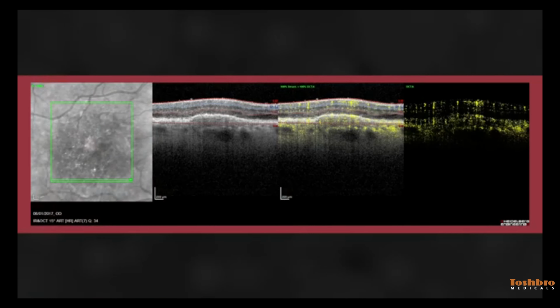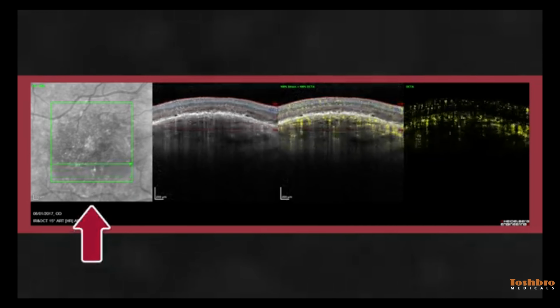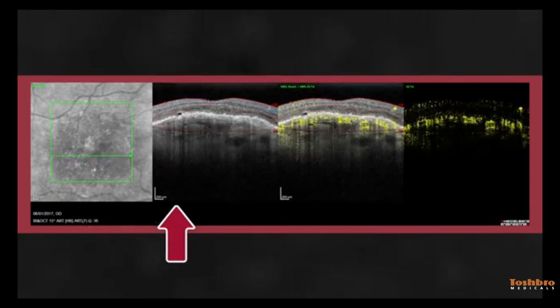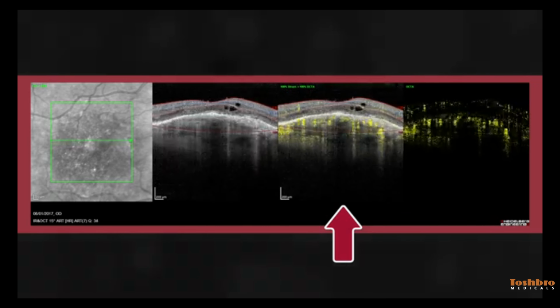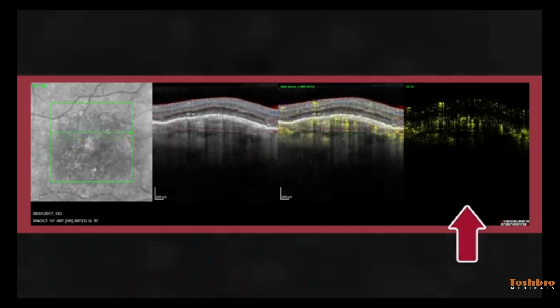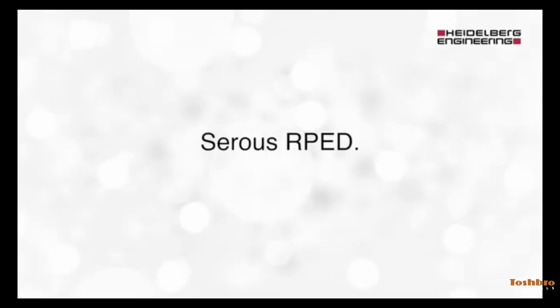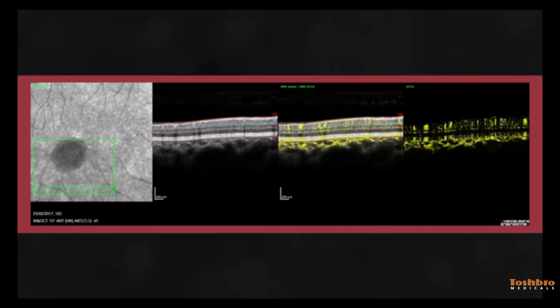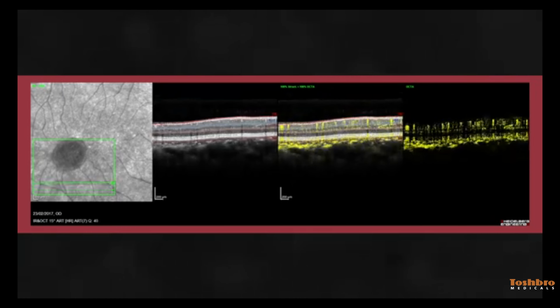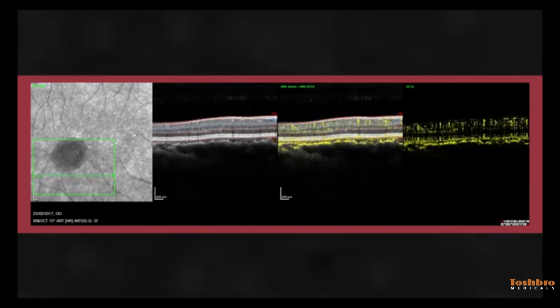In this exported video presentation, we can see the fundus reflectance image with the moving B-scan position, the structural B-scan, the structure with the overlaid flow, and the isolated flow information within 3 separate panes. In this example, we can see structural OCT plus flow. We try to identify non-physiological flow. Of course, we can see physiological flow within the choroid and retina.